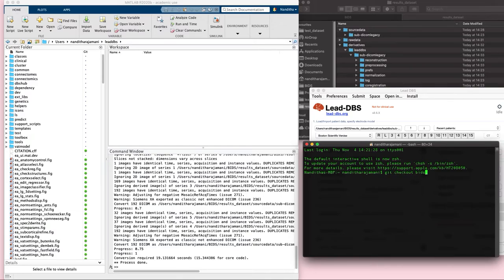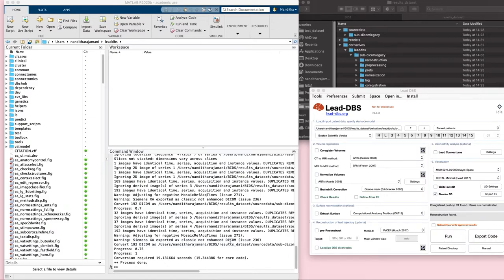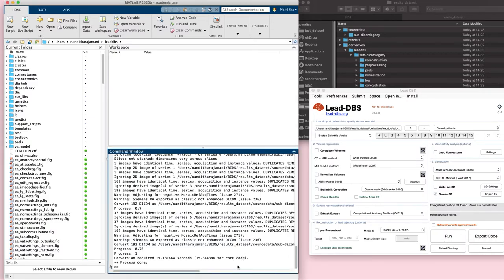So this will take you to the BIDS branch, and once you click enter, you can pull all the new changes by using git pull. If you have SmartGit or the GitHub Desktop application, then that should also be pretty straightforward to do. Once you've pulled all the new changes, you are up to date on the BIDS branch, and there are a few configurations that you have to do to move from your develop branch to your BIDS branch.